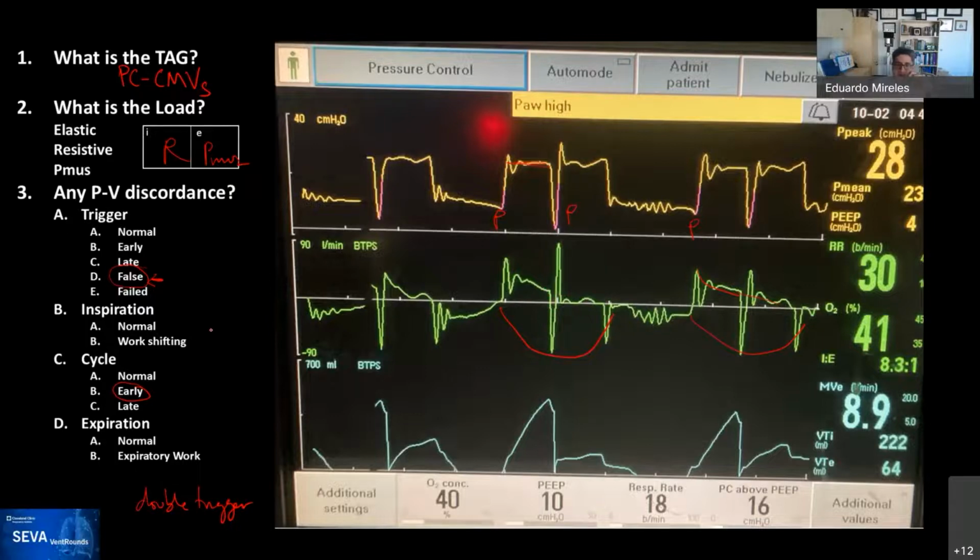Does that make sense, Erin? It does. If you did an end expiratory hold where you kind of cleared the secretions in the tube, would you still see those crazy oscillations all the way through the hold? Well, no, because you close the flow. Okay. So you essentially block it. So that was my suspicion when I saw this. I was walking and said, "Oh, this patient's doing a lot of effort," but essentially he was doing a little effort, and the machine was sabotaging him, and he was air trapping on top of that with secretions and not doing very well.